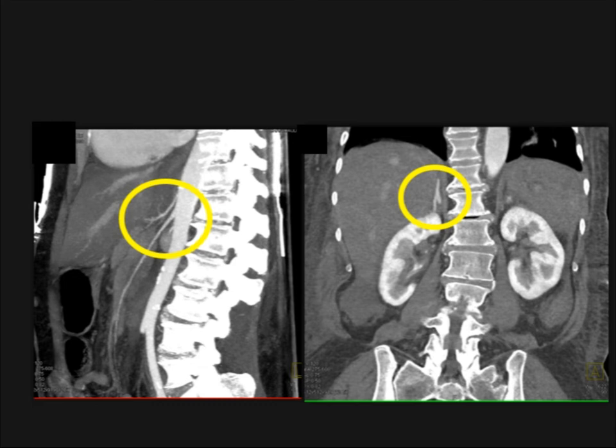There's poor flow, and you have to worry that this patient will develop ischemic bowel due to a low flow state. When you look at the coronal images, you see very bright adrenal glands. You really see the right one particularly well. And when you see bright adrenal glands, we think about the patient being hypotensive. So when you look at the choices, there really is not many choices. This patient is hypotensive. Answer B is the correct answer.